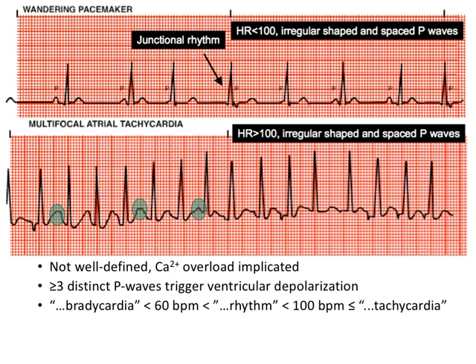So different foci activating. The signal obviously gets through. It's relayed by the AV node, because for every P wave there is a paired QRS complex. So the whole heart does depolarize. The ventricles contract. The signal gets through, which is not the case all the time. Even the wandering pacemaker, not all the P waves get through.